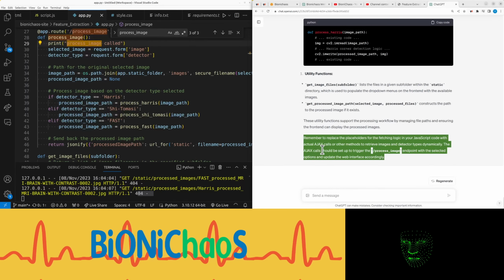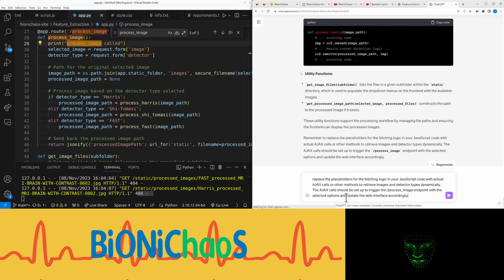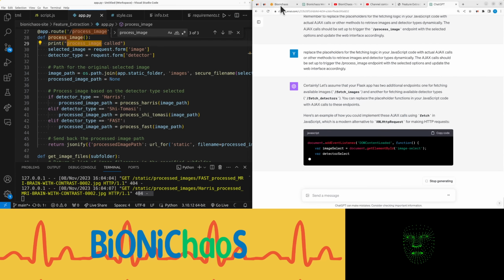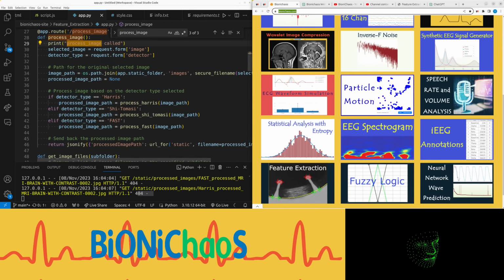Remember to replace the placeholders for the fetching logic in your JavaScript code with actual AJAX calls or other methods to retrieve images and detector types dynamically. The AJAX calls should be set up to trigger the process_image endpoint with the selected options and update the web interface accordingly. Okay, can you do this for us? So while it's generating, hopefully this thing will appear on the site sometime soon.